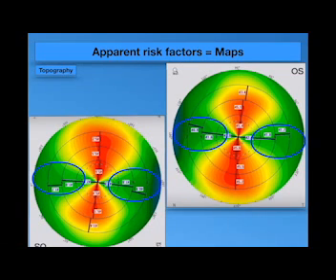Then at the center it is 45.4. I'm talking about the picture on your right side. When you cross the center going to the inferior part of the bow tie, you will find that the figure at each point is almost the same as its coinciding point in the upper part. It's 45.6, 45.5, and 45.2.